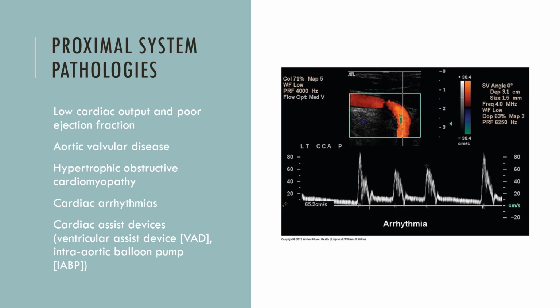Cardiac arrhythmias. When you see these, the heart's beating irregularly, and so you never want to take your systolic and diastolic measurements on the first beat after an arrhythmic event. So this little waveform here, I would not measure that. I always want to try and get nothing before the third beat. So here you see they're accurately measuring on the third beat here. But these can be very challenging because with the arrhythmia, you'll see these unusual changes.